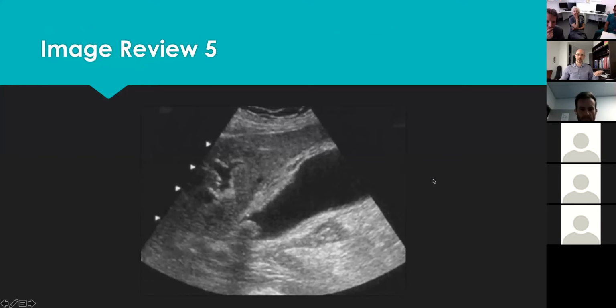Otherwise, usually on either the right side or left side, there is a scale in centimeters in this case. And ideally, you would have some calipers actually measuring it there. And there would be a good area to measure it because, as I said, it's a curved probe. So this is actually perpendicular to the direction of the ultrasound beam in that area. But this beam here is coming this way. So anything away from perpendicular is maybe 45 degrees to the gallbladder wall. Does that make sense? Yeah.